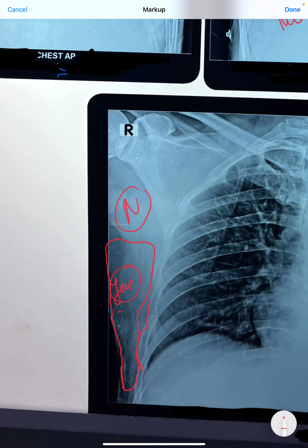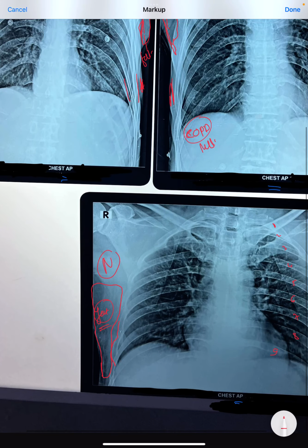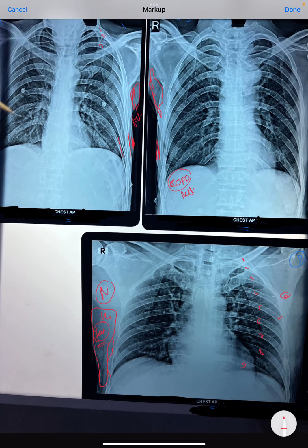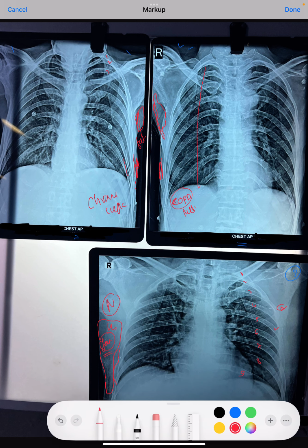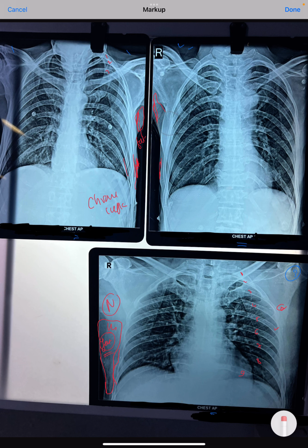This is more of a healthy fat because there is no inflammation in this patient. That is the reason why this fat is preserved. The fat is not lost, and in both of these X-rays there is significant loss of fat because of the chronic inflammation. So the presence of hyperinflation, and of more anterior as well as posterior ribs, which can be well visualized on the X-ray, definitely tells us that this is emphysema.